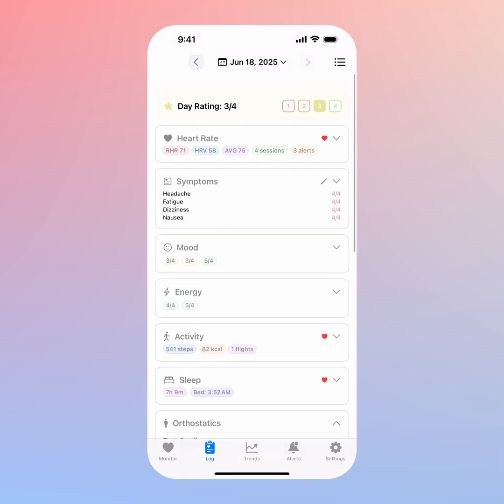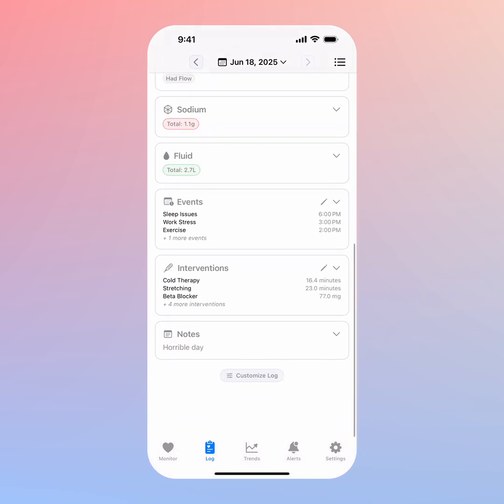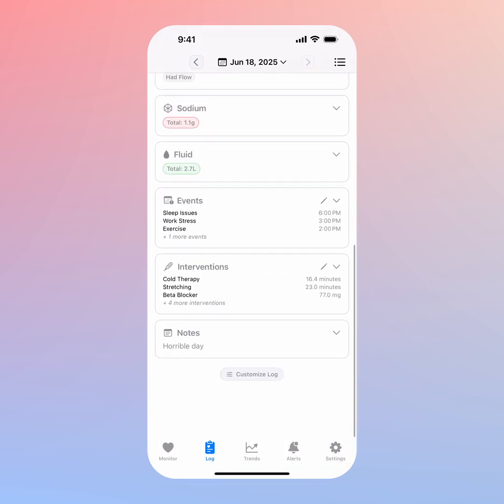And also, second, I want to make these notes or sessions searchable semantically. So I want to be able to easily find things that happened in the past using natural language search, which I think is pretty important.